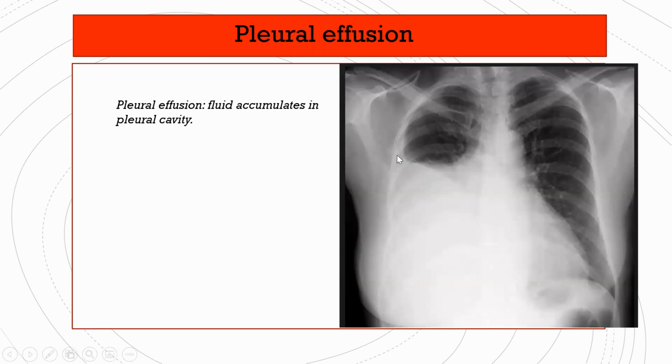Yeah, there we go. This is completely white out. It can't be pneumonia this big, right? And you can almost see the meniscus, which is like, you know, if you put water in a glass, it will be a tiny bit like this. That's the way the water sits, right? And if the patient does an X-ray lying down, actually you won't be able to see this top bit because when you lie down, the fluid just goes on the whole part of the lung, doesn't it?